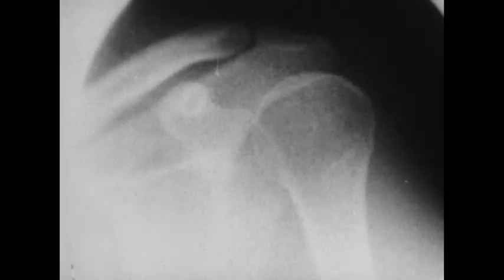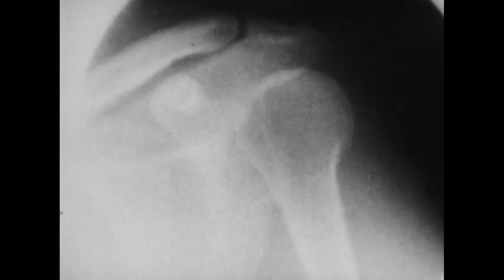Flexion has greater motion than extension. In abduction and adduction, the scapula is fixed, and the head of the humerus rolls and glides within the glenoid cavity. In circumduction, the head describes a cone with its apex at the glenoid. In rotation, the head of the humerus turns medially or laterally in the glenoid in a gliding motion. The next joint, the elbow, is a hinge joint with mixed gliding and rolling movements.